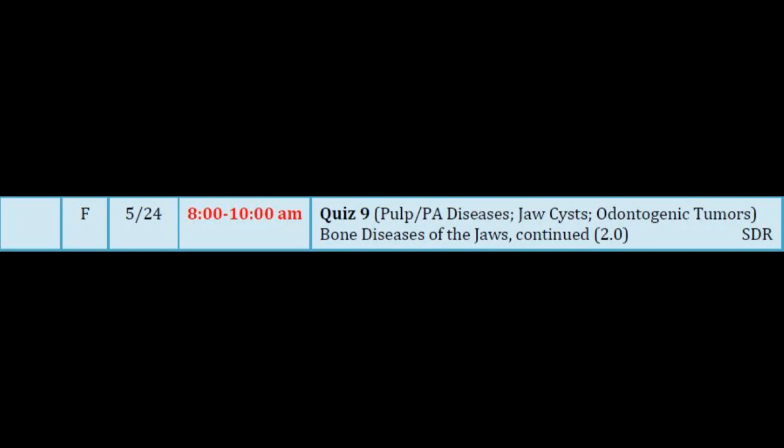Radiographically, do you see the ground glass bone? And can you tell it's expansile? Do you see a border to it? No, you don't see a border. If we have radiographs further anterior, we're going to see that there's a very gradual blending border with normal. You can't exactly put your finger where it changes from normal to abnormal. And that's typical. That blending border is typical. A sharply defined edge fits with a neoplasm. That blending border fits with a developmental process.